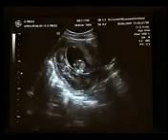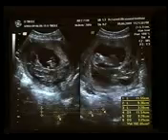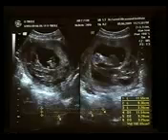Here is a case with gestational sac, embryo, and you can see a clot here which can be mistaken for molar pregnancy. Here is a gestational sac, placenta is here, and there is a large clot there. Its volume was 182 ml.